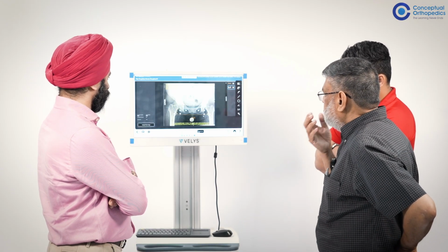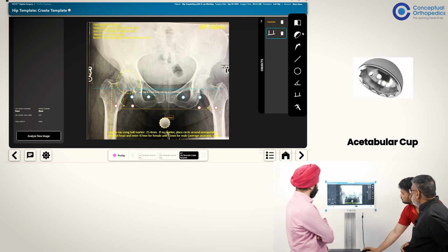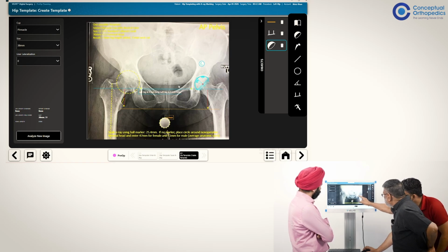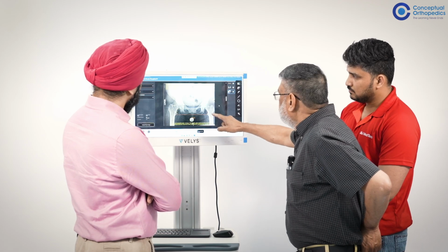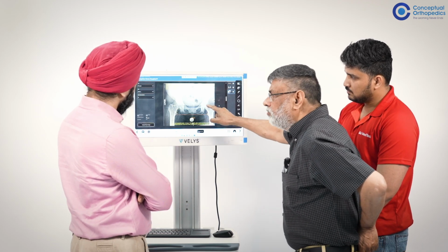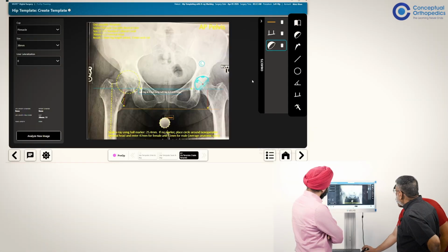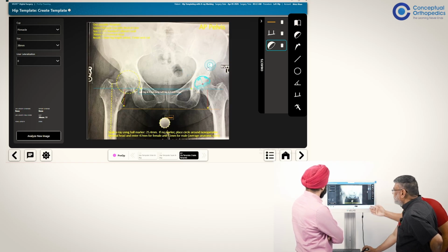Okay. So next thing we will do is get the cup right. We will get an acetabular cup and measure which one will fit in. And the fit will tell you what the inclination is. So this to any horizontal line should be 45 degrees. You can draw 45 here and measure it. Just tilt it, see that is 90 degrees, tilt it to close it completely, so that's less than that. So we say 40, and we can measure that angle.